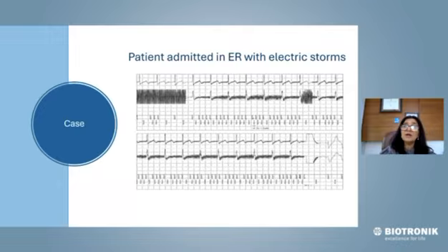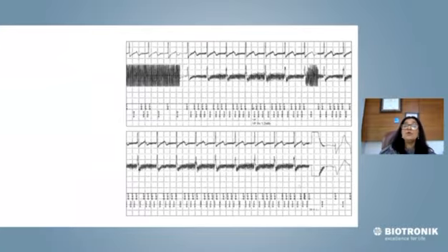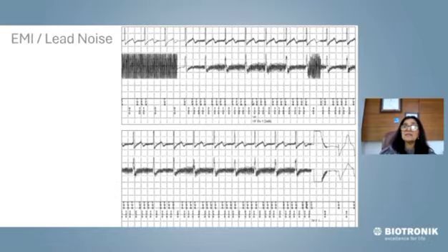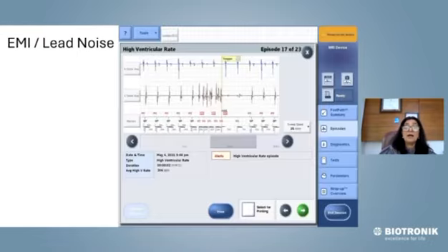Unfortunately, if you look here, this patient was inappropriately diagnosed as fibrillation, fibrillation detected, and charge also delivered. You can see here 34 joules has been delivered to this patient. So remember, whenever these patients come, you have to be good at looking at sensing, look at the impedance, and look at them so you know what to do.